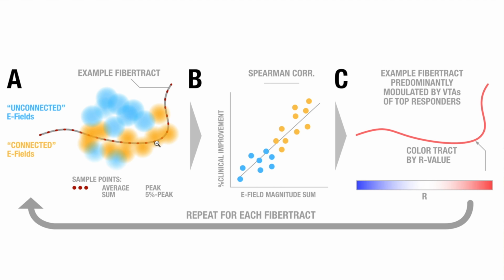Right. So we will get a value for each tract at each sample point. And then we could say, okay, we take the average of these values now, and crucially, for this point, for example, even the E field that is really remote will still have a value, because the E field decays quickly, but it still has a small value here, right? So at least most of the E fields will contribute to this and create some sort of value in here.